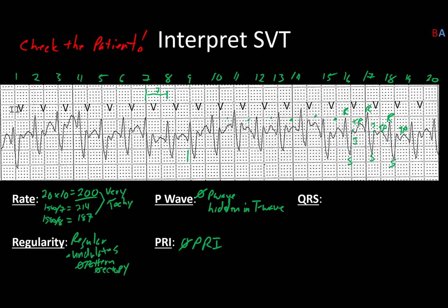And then your J point ends about right here, just barely on the other side. 1, 2, 3. And so if we look over here again, any of these other ones here, number 7's a pretty good one because that starts on a solid dot. And this J point again ends right about here. 3.